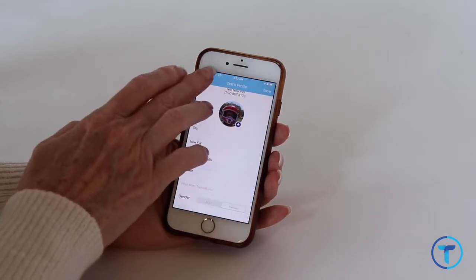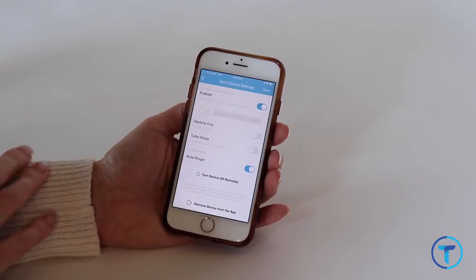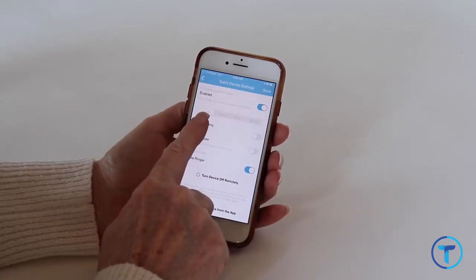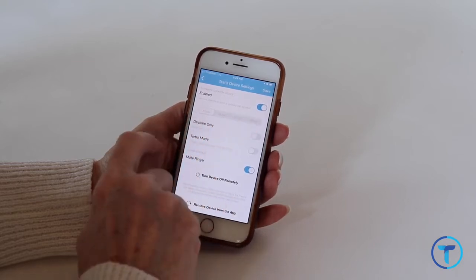The far right gear icon is the settings. Make sure it is enabled. 15 minutes is the default, but if you'd like to change the frequency of updating your map, you can change it here. With 4 different options, you can pick what works best for you.